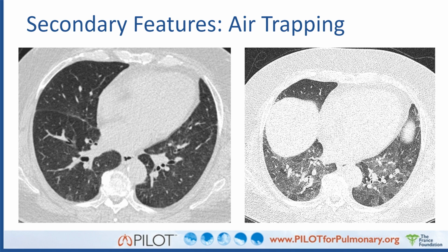The next thing we do if we think that it's a disease of the dark area is to get an expiratory CT scan. If the findings become more obvious to us, then it is air trapping, small airways disease. And we can say that there's air trapping. So we use the term mosaic on inspiratory CT scans. We use the term air trapping on expiratory CT scans. If the picture doesn't change much with expiration, pulmonary artery hypertension should be in our differential as to the reason that the patient has mosaic attenuation.